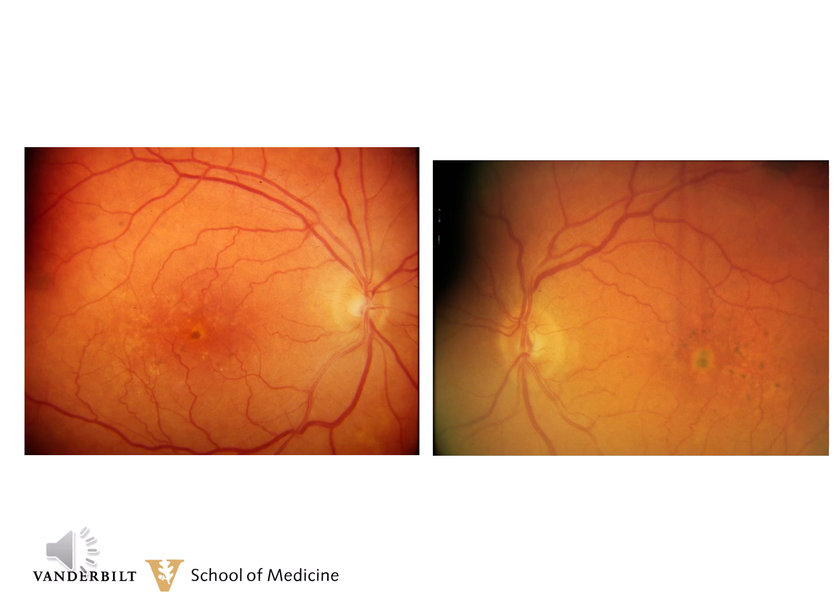This is a 74-year-old man who has not only the typical vitelliform lesion centrally, but there's also pigment clumping around the central area of the macula. This pigment clumping could also be a pattern of pattern dystrophy as well as a type 1.